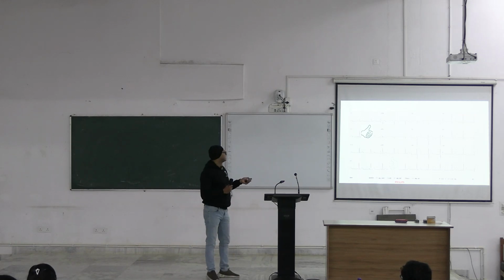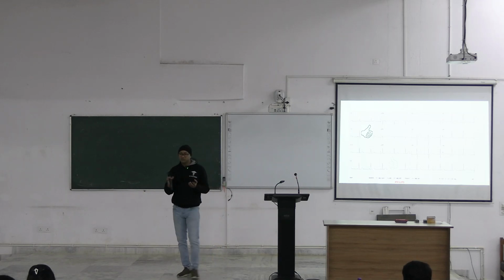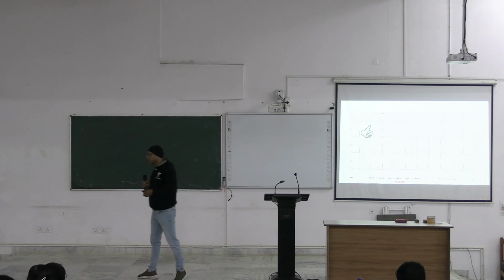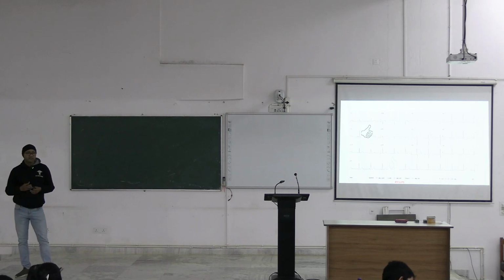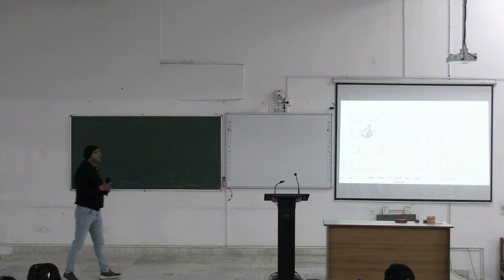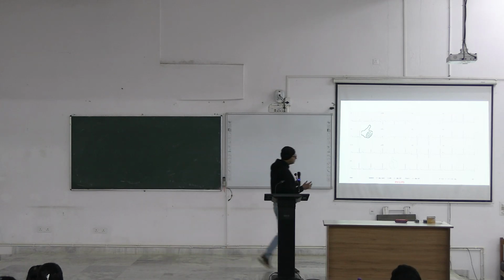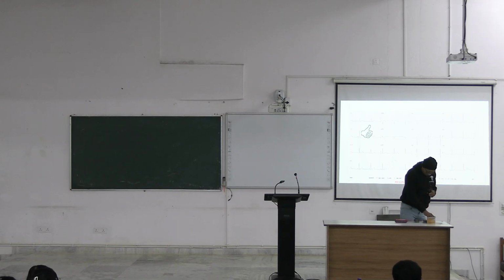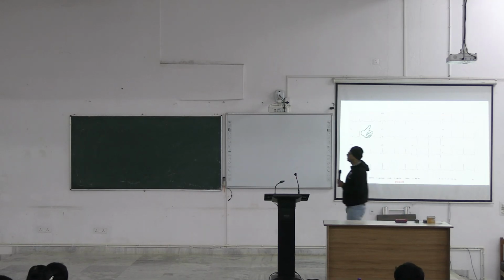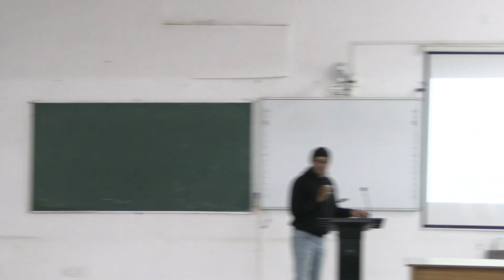So, here I can say with the help of thumb rule that it is normal axis, but I can't exactly tell whether the axis is 60 degree or 70 degree. So, today we will learn how to determine ECG axis very accurately, in degrees. To do that, I told you that you need a scale, a protractor, and a pencil. So, today we will determine the exact axis from, say for example, this ECG.